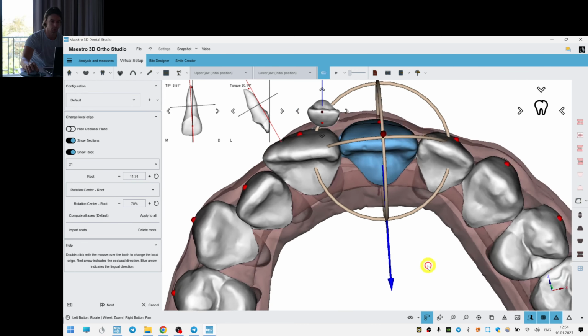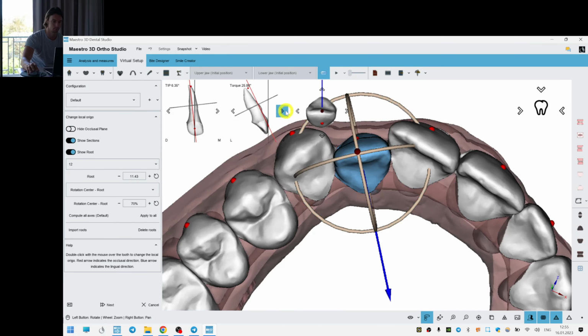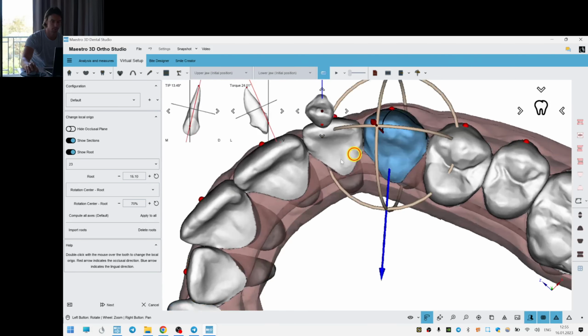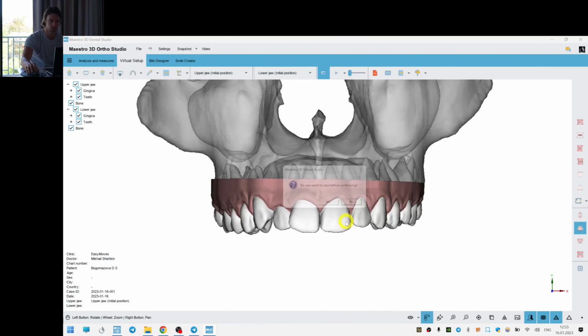Yep, it should look like this. Looks like I completely missed them. Okay, now it's better.